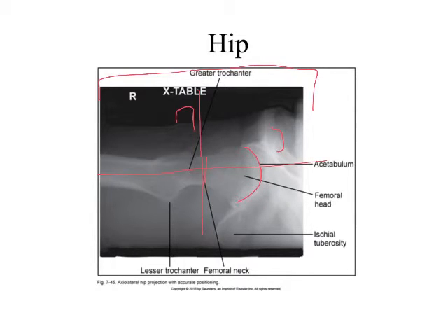I'm not really able to evaluate the joint very clearly on this picture. There's too much superimposition. I'm going to use the AP to look at the joint, right? I'm just looking at the neck, right? Now, one additional criteria would be if there's any hardware, which chances are if we're doing something like this, there's either a fracture or there's a repair, right? So in the case that there is hardware demonstrated on the image, I would want to make sure that I have included all of the hardware, right?